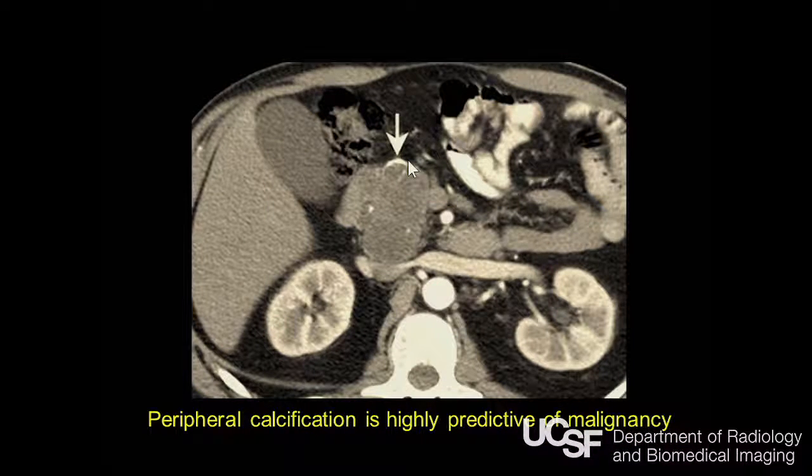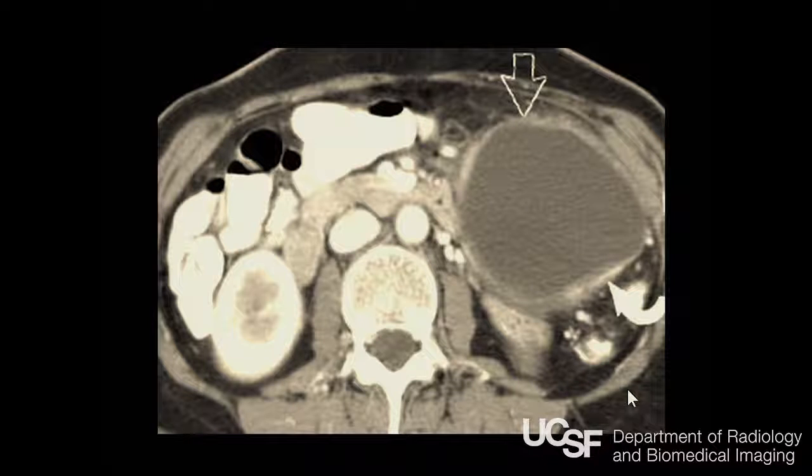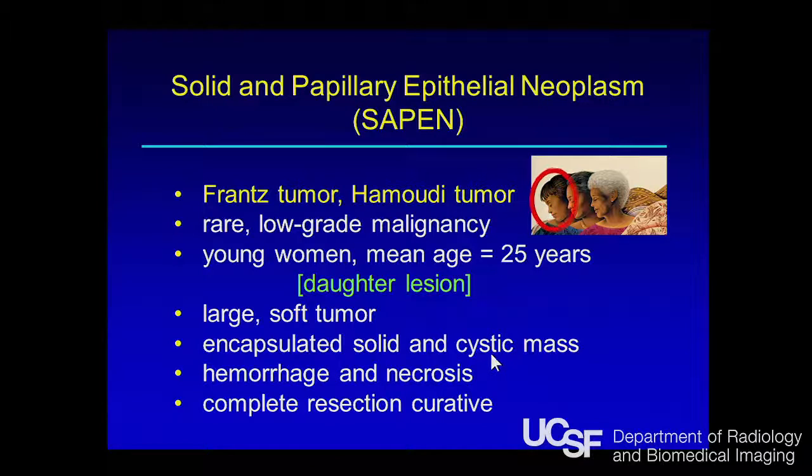And as I mentioned, 15% will have this rim calcification. When you see calcification, this is much more likely to be malignant, already frankly malignant, and obviously comes out. Here's another lesion, unilocular in appearance, thicker wall, and you can see wall calcification posteriorly.